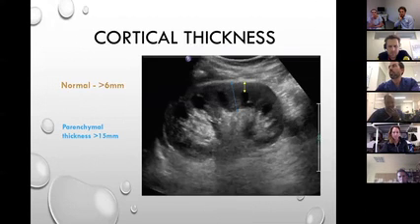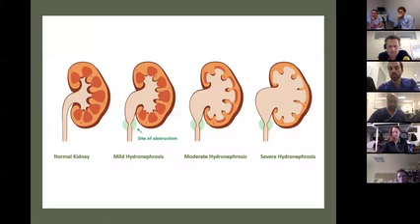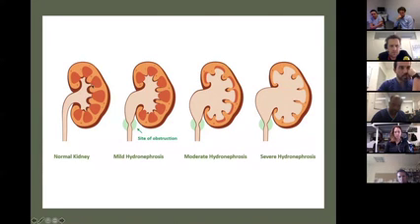So, all right, moving on to the first pathology, that's your hydronephrosis. All right, quick schematic. That's your normal kidney. So obviously you've got a capsule, cortex. You've got your pyramids. Very, very important. You need to know this papillae. So we've got a pelvis, major calyx areas, and minor calyces, and you've got this cup-like papilla where the renal pyramids come and join there.